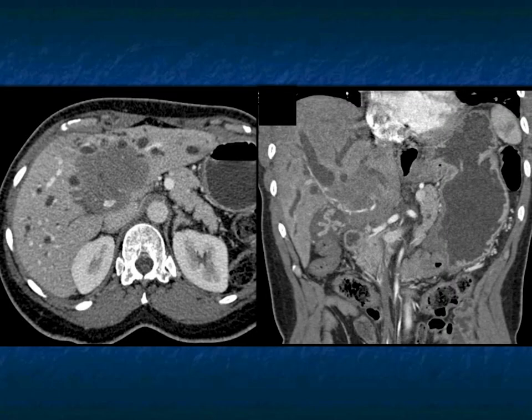This patient presents with jaundice. There's a large mass in the liver and there's central duct dilatation. So what are you thinking about? You can think about hepatoma, but most hepatomas don't cause dilated ducts. You can think about metastasis. You can think about a tumor infiltrating from like the pancreas growing up, but the pancreatic duct is not dilated. The most likely thing I'm going to say here is cholangiocarcinoma. Cholangiocarcinomas are central tumors in the liver, often solid, not very vascular, and cause duct obstruction. So that's my most likely diagnosis.